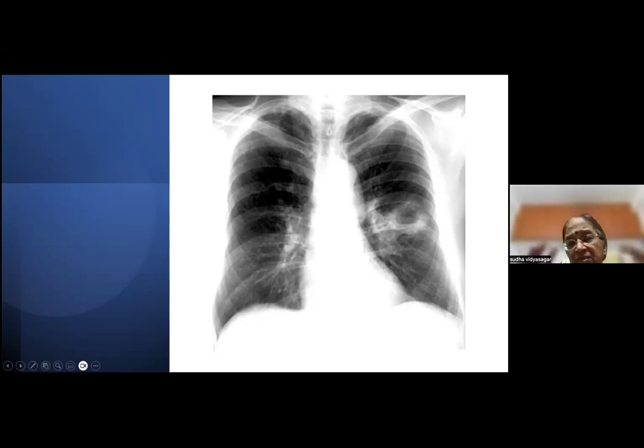If somebody aspirates in the sitting position, they would probably get a lung abscess or an aspiration down to the lower lobe segments, okay? Or if they aspirated in the lying position, it would go to the posterior segment of the upper lobe, okay? And of course, the lower lobes, the posterior segments, but this is somewhere in the middle here. Looks like the apical segment of the lower lobe. That's where this would probably come. We don't know. So that's why, the odd position, you must keep one more differential in mind. Probably there could be a malignancy. Okay.